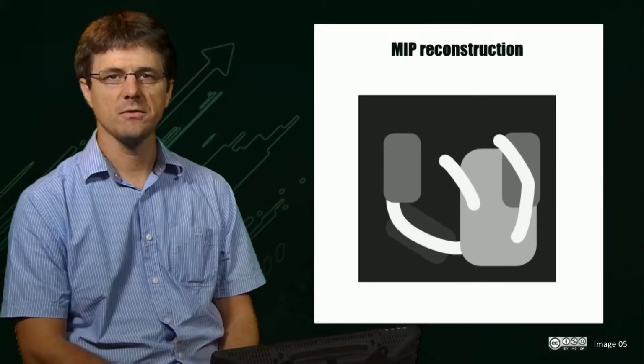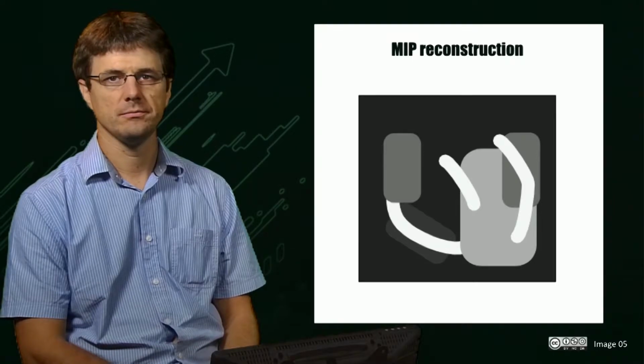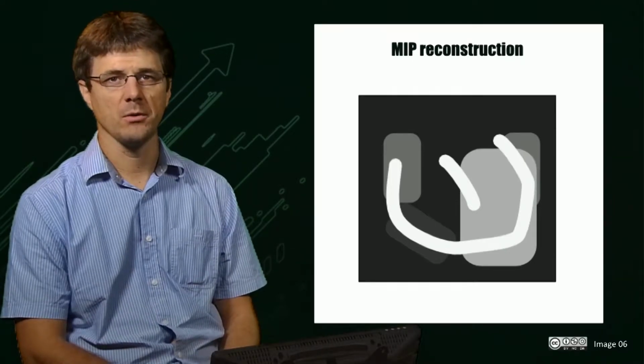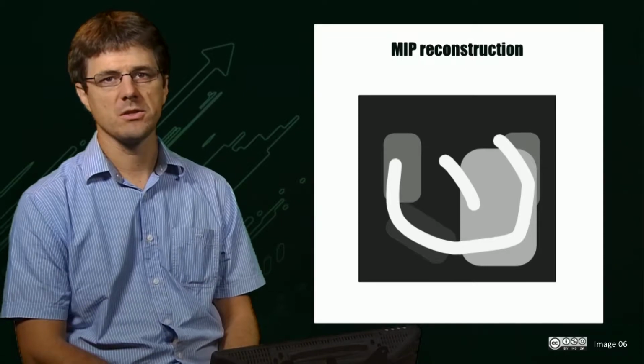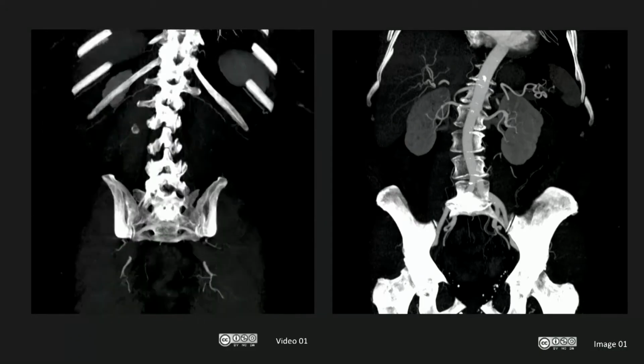While it is close to visualizing the bony structures we want, parts of it are still obscured. In a MIP reconstruction, we project the maximum value across all 3 slices for each pixel of the image. This gives us a result that can much better visualize the bony structures. We can now see an example of this on real data.